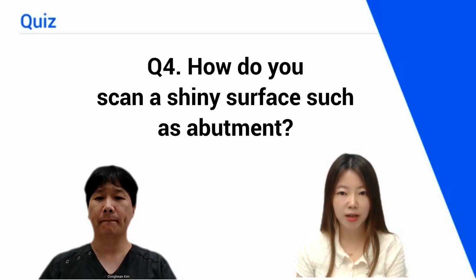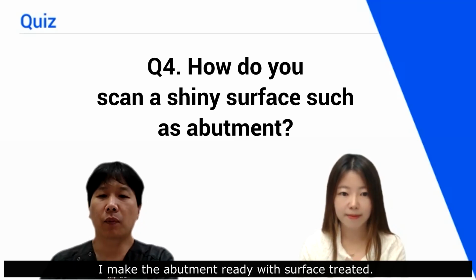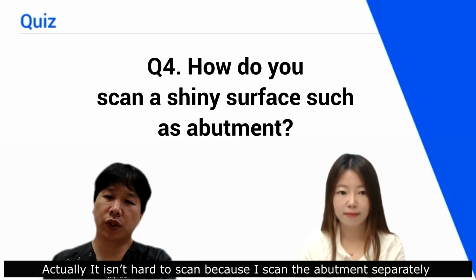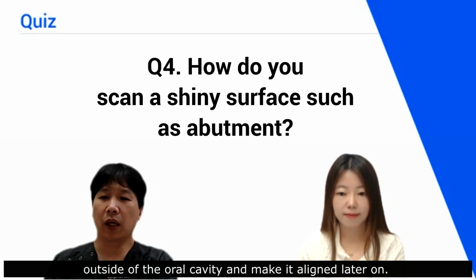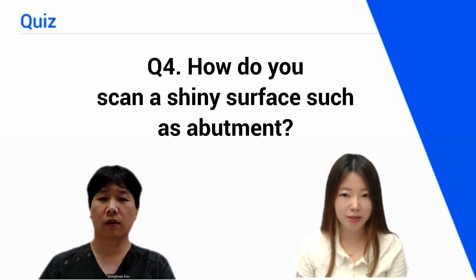I see. Question number 4. How do you scan the shiny surface, such as abutment? I make the abutment ready with surface treated. The upper part of the body is sandblasted and the lower part of the body is polished. Actually, it isn't hard to scan because I scan the abutment separately outside of the oral cavity and make it aligned later on. In a case when there is a shiny surface, I recommend you to use a scan spray. Okay, thank you for answering all the questions today.